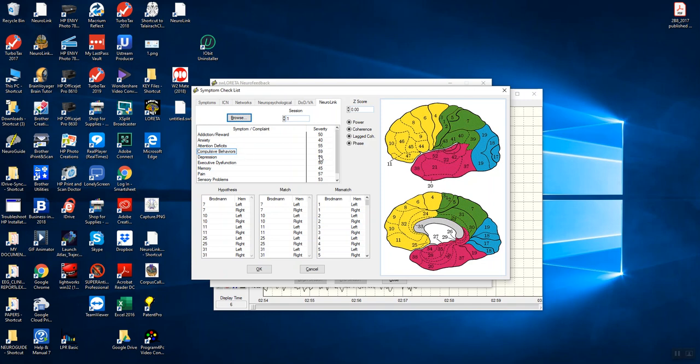For example, here's the depression network. We can select any of these. The hypotheses are network hubs produced by the over 30,000 peer-reviewed journal articles in the National Library of Medicine database, that is PubMed. Most of these are PET scan. They're much more accurate than functional MRI and replicable. And at the National Institutes of Health, we cross-validated EEG and magnetic encephalography with PET scans and SPECT scans.